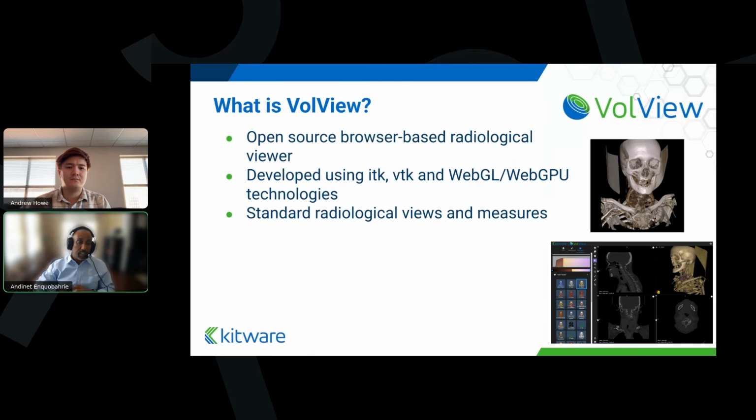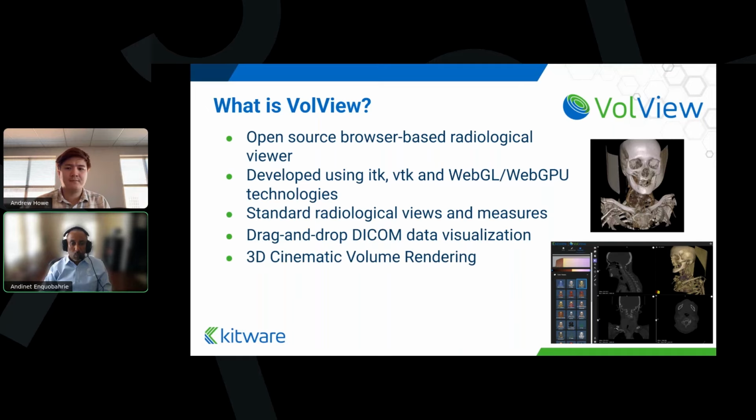It has all the basic standard radiological operations and measurements like annotation and windowing, and Andrew will be demonstrating some of this. But besides these standard radiological functions, VolView has a way of doing 3D cinematic rendering.